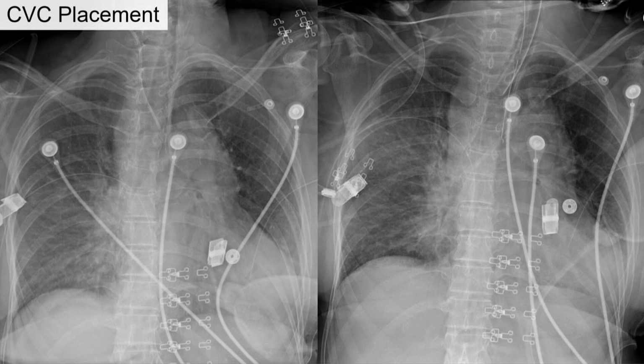All right, I'll finish up with this one. This was a woman that was undergoing some sort of breast surgery in a surgery center, started crashing, did not have a central line in, so the anesthesiologist in a crash situation put in a right-sided central line, and they weren't getting blood return, or weren't getting much blood return. So they got a radiograph, and we have this radiograph. Now, we don't have a pre-op chest film, but I think we'd all recognize this isn't really going where we think it should be for a venous catheter. And also the mediastinum looks pretty wide here. So there's a big concern, not getting much blood return, etc.